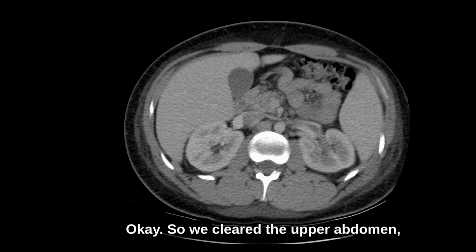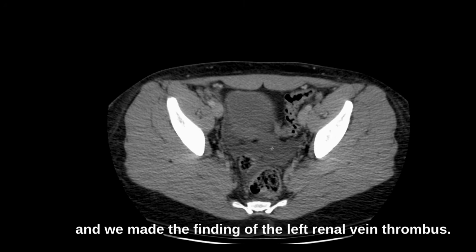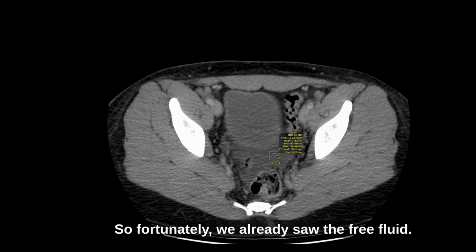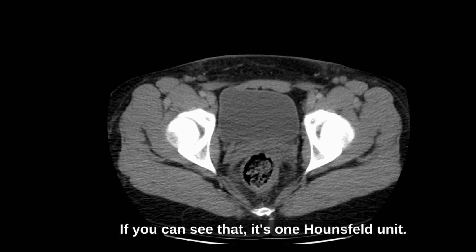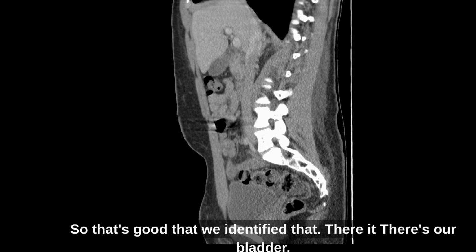Okay, so we cleared the upper abdomen and we made the finding of the left renal vein thrombus. That's good. And we just go into the pelvis. Fortunately we already saw the free fluid, and that sort of tipped us off that something might be wrong. So we'll just check that free fluid again. If you can see that, it's 1 Hounsfield unit. So that's simple fluid. So that's good that we identified that.